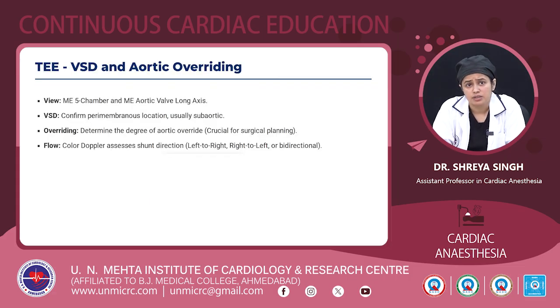So on TEE, usually the mid-esophageal 5-chamber and the mid-esophageal aortic valve long axis views are used to see the VSD and the aortic override. We confirm whether it is perimembranous or subaortic. Then the degree of aortic override is confirmed, which is crucial for surgical planning. And color Doppler helps us in assessing the shunt direction, right to left, left to right, or bidirectional.